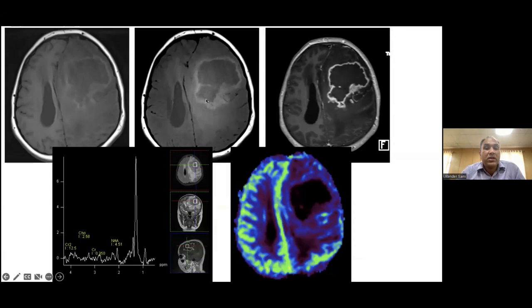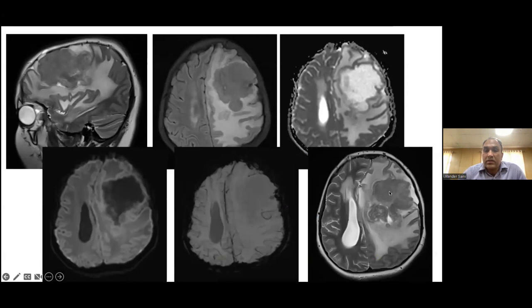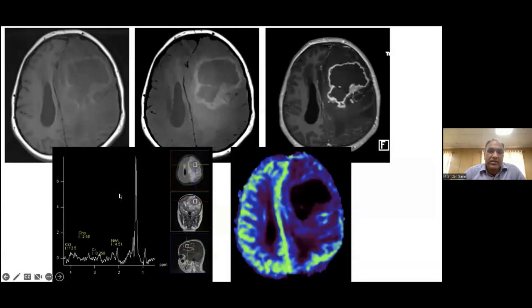When we apply this sequence for certain lesions like multiple sclerosis, it is useful, and in cases of suspected tuberculosis, it is useful. So in this particular case, the center part is again looking necrotic, but on T2, it is not looking bright. That is odd. So this is a clue that this is not a mass lesion. In a mass lesion, we would have expected this particular area to be cellular, not show this kind of diffusion characteristics, and should have shown enhancement.